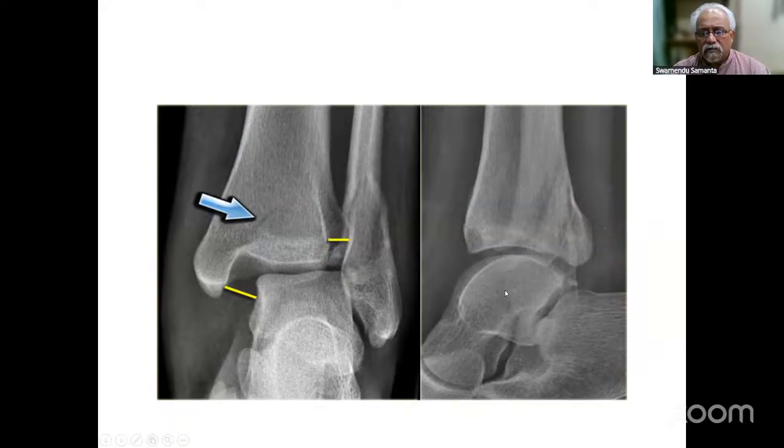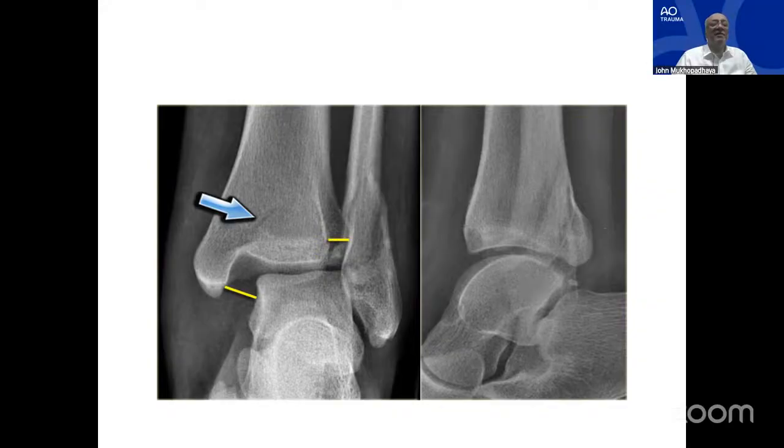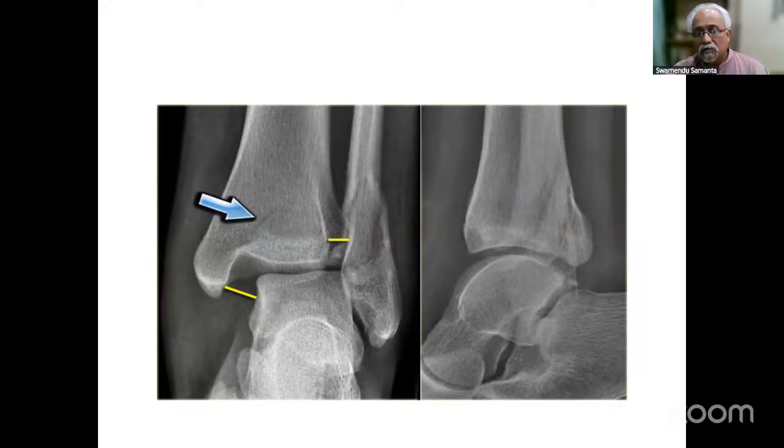Anybody can volunteer. So this is one X-ray, a radiograph of the ankle. Can you tell? Because this is a very common radiograph. Okay. Anybody, please volunteer. Someone says this is the fracture of the posterior malleolus. First, you tell about the posterior malleolus. Didn't I tell you in the very beginning of reading the radiograph that you go sequentially?